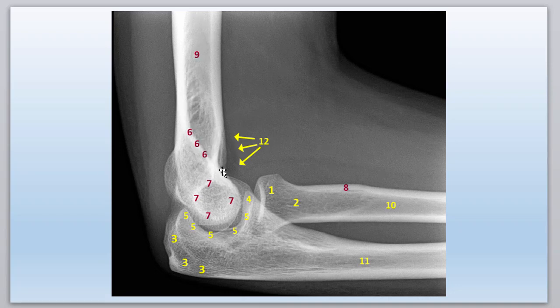This is the supracondylar ridge here. You can see another increased density of bone. They're superimposed upon the top, so you can't really tell if it's the medial or lateral. And so I think I got all this stuff covered.